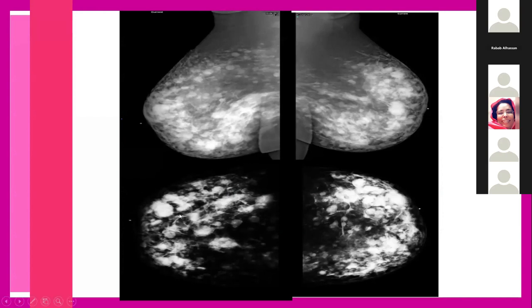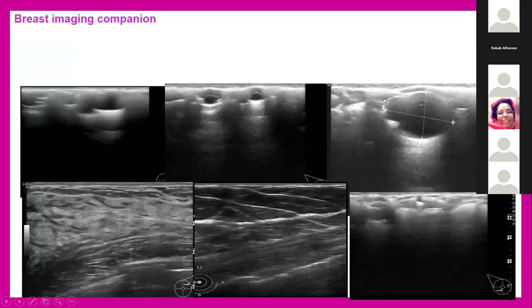And the clue here, you can see the adjacent fibrotic reactions and the snowstorm appearance. These are small, it seems to be cysts, but are not typical cysts. Okay, these are silicone granulomas, obscuring the background breast. This is my patient. Okay, can you compare with a normal breast here? These are normal, fatty. This is fatty breast, so this is normal glandular breast.